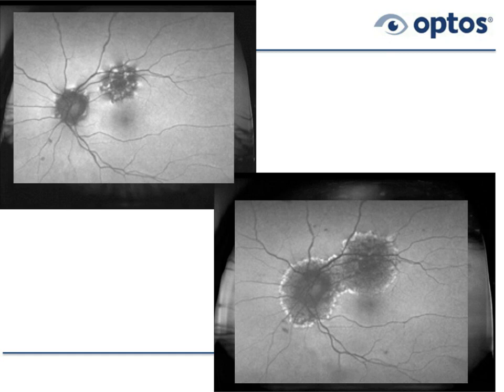She had cataracts removed. Her age was about 65 at the first presentation that we saw in the upper left. So at this stage, her AZOOR seems to be active, but it doesn't look like it's going into the fovea. So a patient like this actually has to be seen every month or so to make that determination whether the patient should be treated with some med for autoimmune disease, which this probably is.